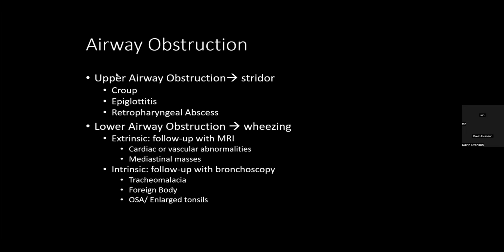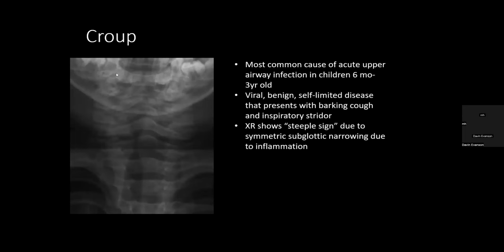And it could be with kids that put anything in their mouth, so always worried about foreign bodies. Also worried about infectious causes, croup. There is the steeple sign. We're looking at the airway.